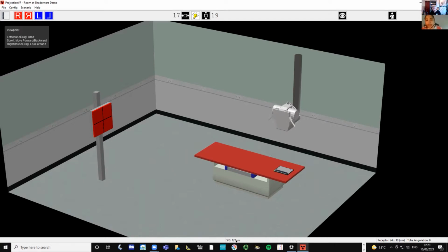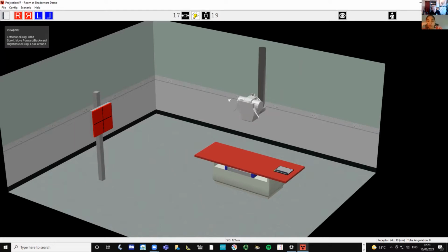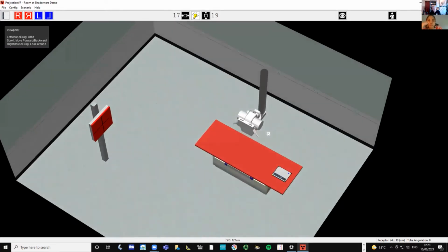What about the table center lines? Oh yeah, good question. As I move along, it will automatically lock the midlines. And then as I move along here, it will lock automatically. That wasn't me, and now that's locked over the detent. So that's perfect. You see, nice.